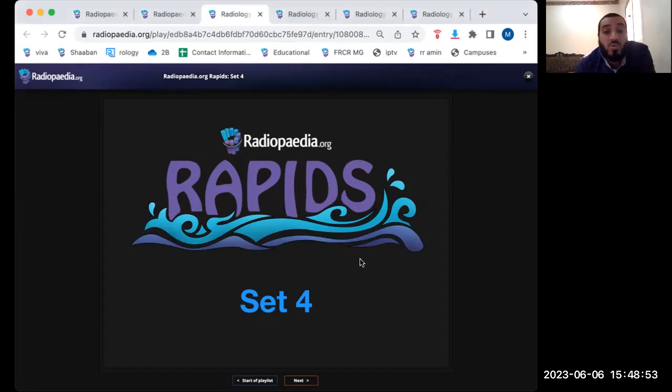In 10 minutes, we should go through the 30 images and pick around 10 to 12 abnormalities. You should train on this many times. Misplaced chest lines can come, I think, no.